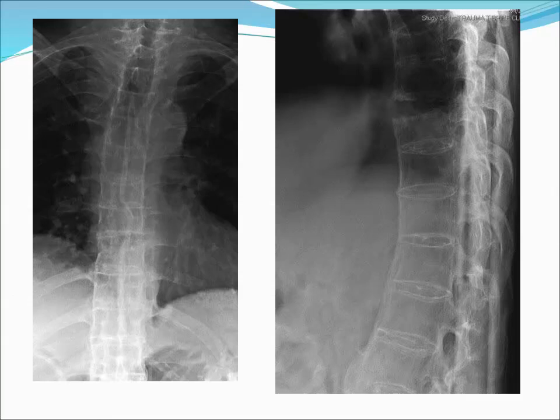AP radiograph of the thoracic spine demonstrates multi-level ankylosis with a subtle cleft-like lucency at the T8-9 level. Lateral view reveals the distracted fracture at that level to better advantage, large arrow. Additionally, thin marginal syndesmophytes, characteristic of ankylosing spondylitis, are better demonstrated at other levels, small arrows. Spinal fractures can occur in patients with ankylosing spondylitis with even mild trauma owing to the rigidity of the fused spinal column. Fractures may extend through the ankylosed disc, as in this case, as well as through any part of the vertebral elements, and commonly involve all three columns of the spine.